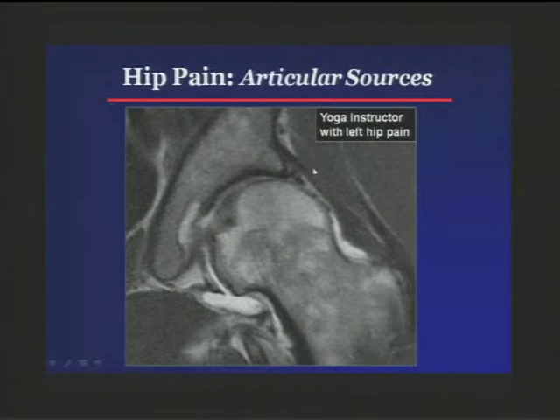This was a yoga instructor with hip pain, and she wasn't all that old, but you'll notice she's got kind of a ratty-looking labrum here. She's got tremendous loss of cartilage up here, but this just looked funny. Remember I said to always look for that ligamentum teres?